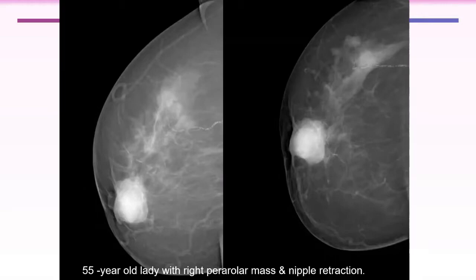nodules, how can you explain these other small masses? So maybe multiple cysts. I need to do ultrasound for her. Yes, maybe. What is your differential diagnosis in this case? Fibrocystic disease, maybe.